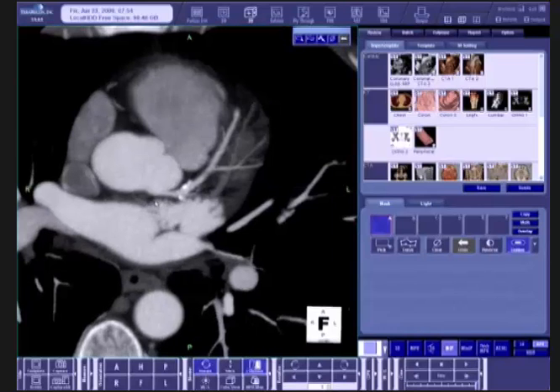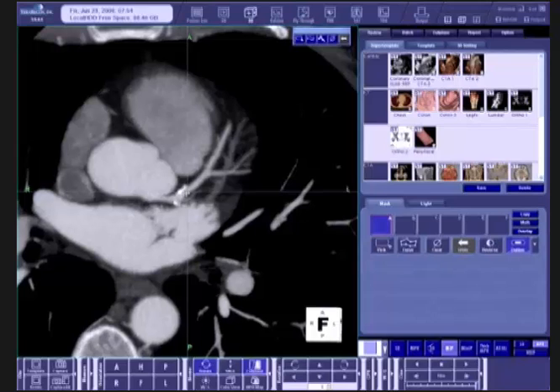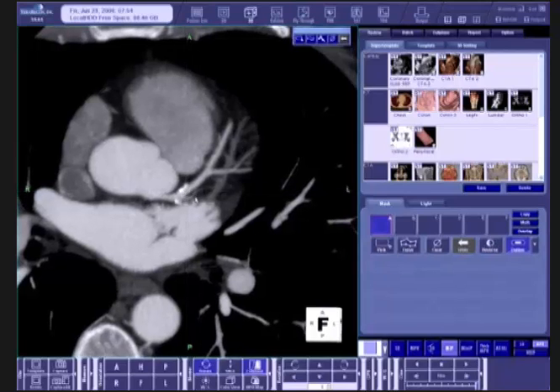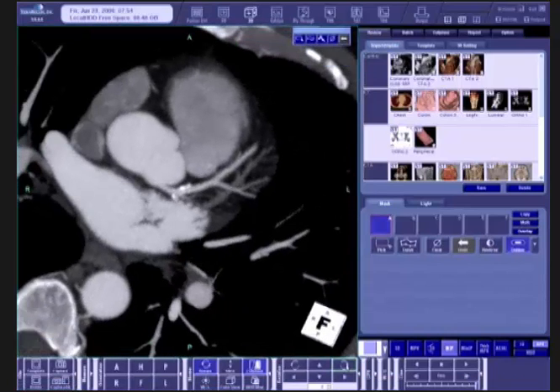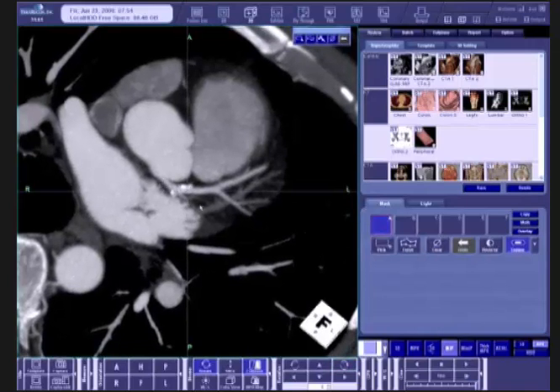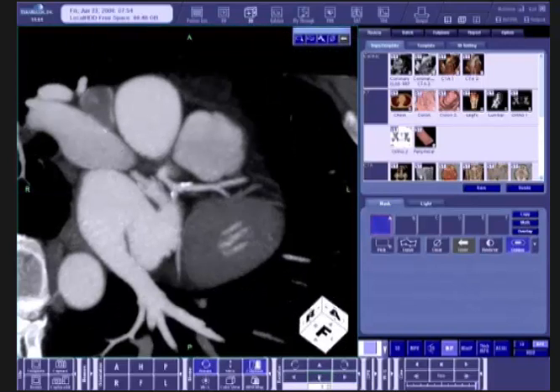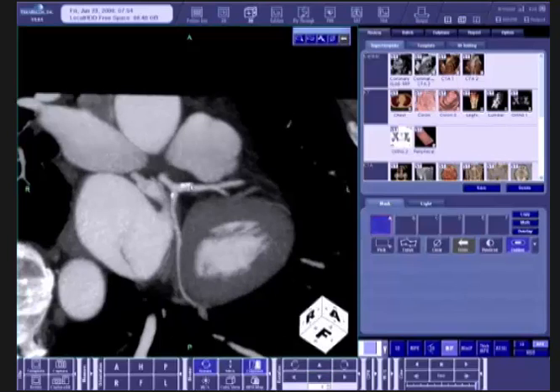You'll notice in this patient that there is some proximal coronary artery calcification in the beginning of the left anterior descending. On a general view here, this appears to be non-obstructive, but I may manipulate the image by rotating in a small plane, and then basically what I call twirling or rotating about this axis by using the controls that allow me to rotate around the coronary. You can see in this view that there is some mild calcified plaque and perhaps some very mild soft plaque, but the lumen is quite patent and there's no evidence of obstruction.